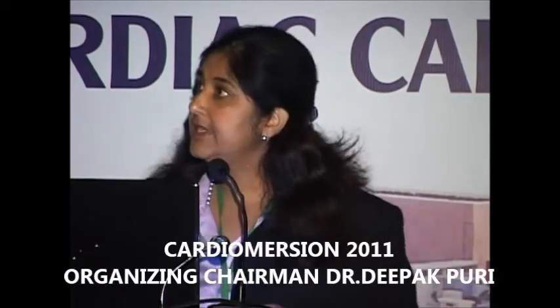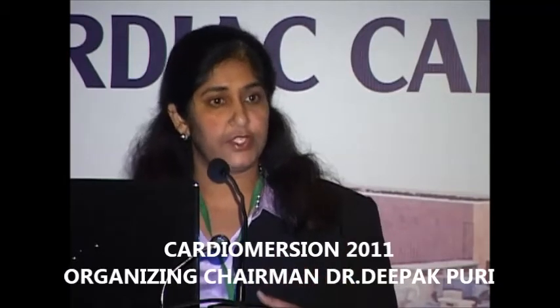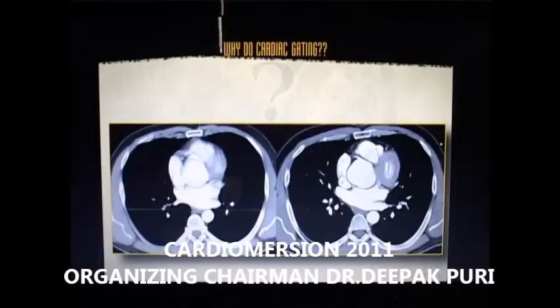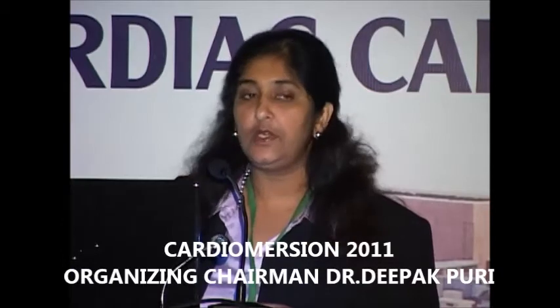This is a standard in my institution: if we have a patient where we suspect aortic dissection, we always gate the study. And now the question is, why should we gate the study? In this patient, who had known Marfan syndrome, we see the region of the aortic root demonstrating these linear lucencies.